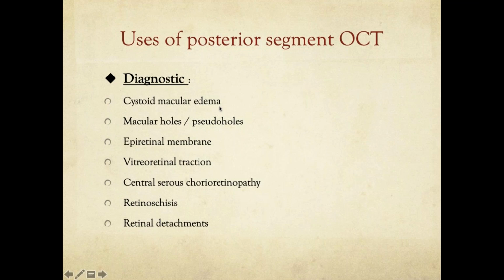So these are the patients I am very concerned about, in the group with cystoid macular edema. Because with other pathologies, for example a branch retinal vein occlusion or central retinal vein occlusion, the patient is already coming to you with a pathology. The patient already has a branch retinal vein occlusion, and the cystoid macular edema is a result of it. So you are already dealing with a pathology there, and the outcome of the disease could go anywhere.